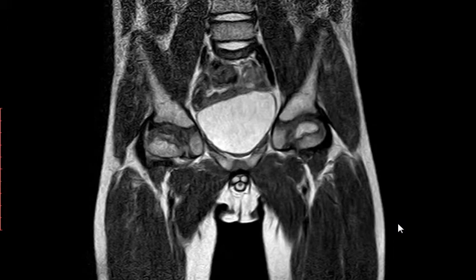Today we will start our case discussion session, starting with this female patient, 7 years old. MRI was requested. I will not tell you what the complaint was. You will tell me what the complaint was. So go for it. Start.